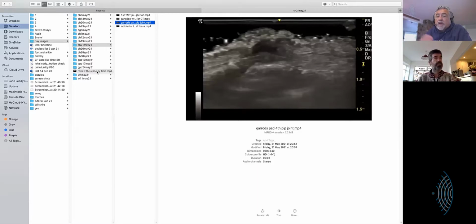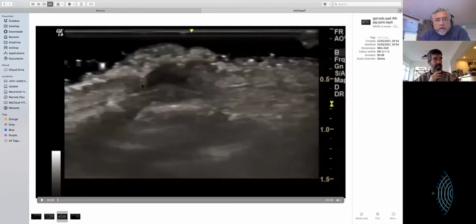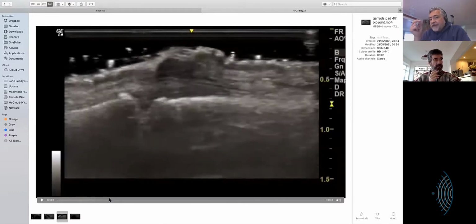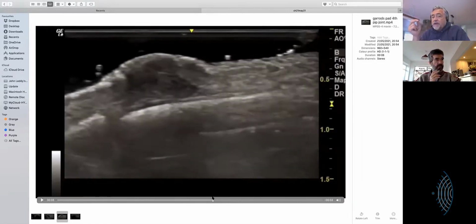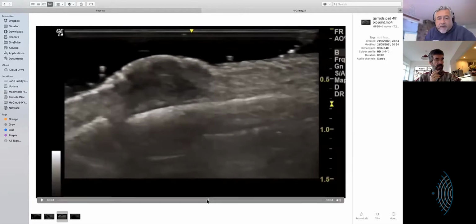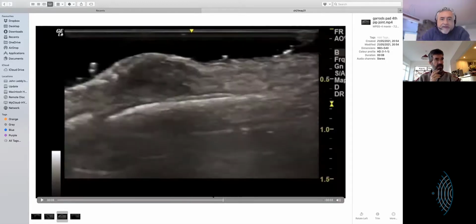Now, you're saying it's not a ganglion because, by definition, the ganglion needs to have a root to the actual joint? It has to be fluid-filled, and that isn't fluid. It has to be a cyst. That's just a dark splodge, a dark bit of soft tissue. You know that because your eyes are registering a ever so slight grayscale. Oh, I see. Yeah, I got it. All right. So just soft tissue.